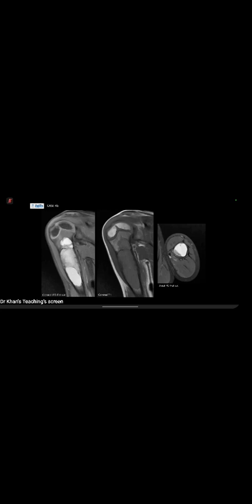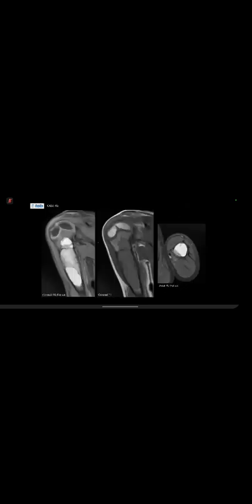Okay, good. So I think this is a tricky case. You tackled that really nicely. The key features are, I guess, it's intramedullary. The one that I've shown you has actually fractured before, which is why you're seeing that on the plain film. You can see the lateral cortex is fractured before within the proximal part of the lesion. And that's why I think it gives that kind of fibrous dysplasia appearance.